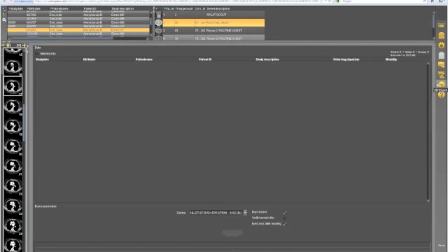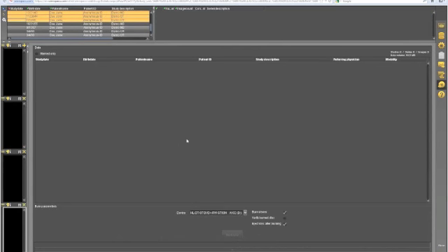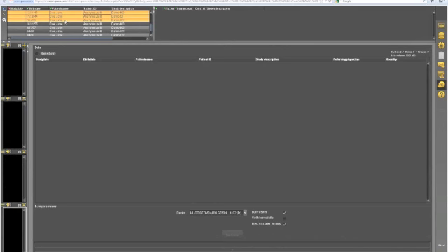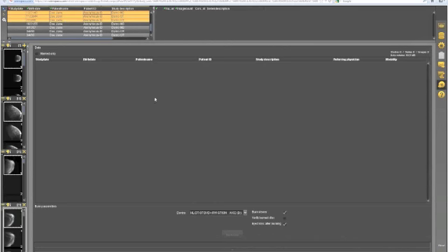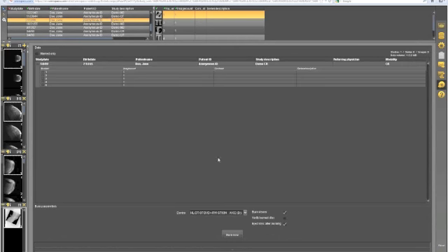This is one of the few features that will only work on Windows. What it is, is just like anything else: you select whatever studies you want to burn to a disk, and just drag and drop them into the main area here. Then put a disk in there and click Burn Now. It's really easy, really straightforward, and it can be done from anywhere that is a Windows PC.